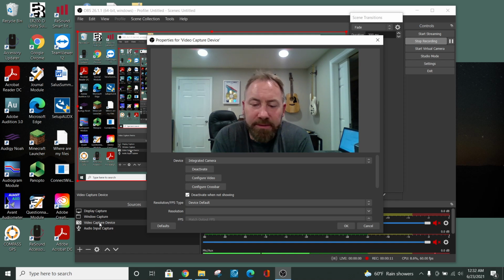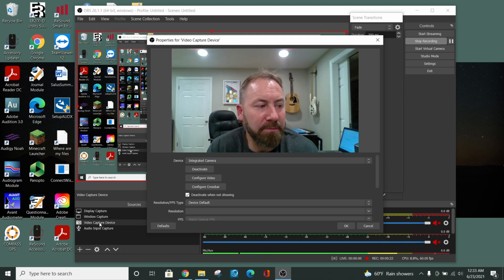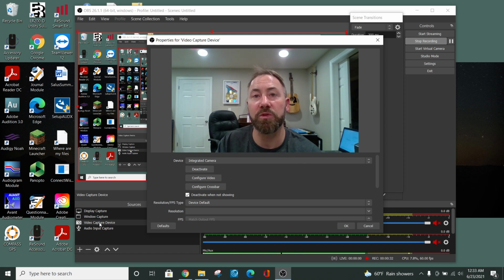I am a Lantos customer and I send stuff to Oticon for custom products. And I have found that uploading scans to Oticon's MyOticon.com has a few tricks to it. I thought this may be a little bit helpful to point out where things work well and where things are a little bit challenged.